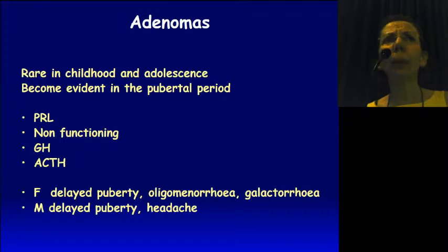Adenomas, we talk about adenomas, but believe me, adenomas are rare in children. So everybody describing an adenoma in the pituitary gland of a child before the age of puberty, don't believe him. Okay? Because at the level of the pituitary gland, you may have many artifacts due to susceptibility effect, due to the presence of air in the sphenoid sinus. And many times people describe adenomas where there is susceptibility artifact.